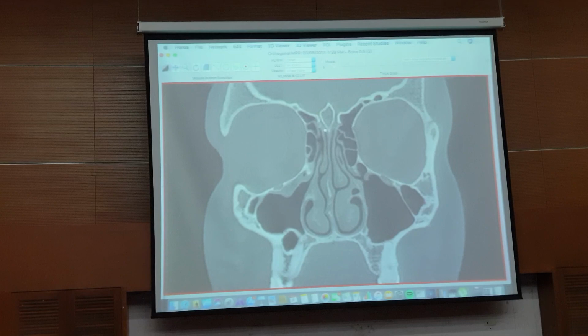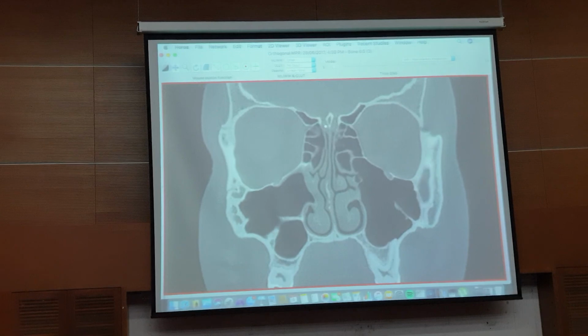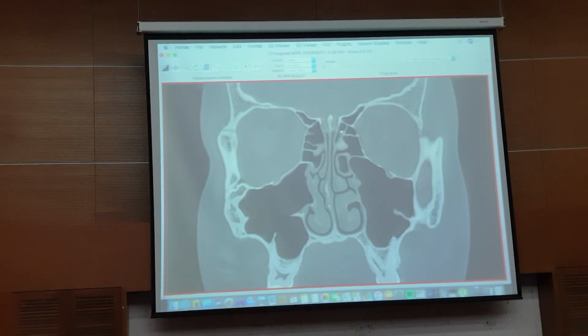If you come from anterior, this is the crista galli. The moment we go a little bit behind, you start to see these two rounded structures, which are the olfactory fossae. They contain the olfactory bulbs. Here is a particularly nice example of the cribriform plate, but it's not often so nicely seen. It is a very thin bony structure after all, so it can be difficult to see, but in this case it's quite nicely seen. You can see that the plate is here. That's the lateral lamella. I think the fovea ethmoidalis.